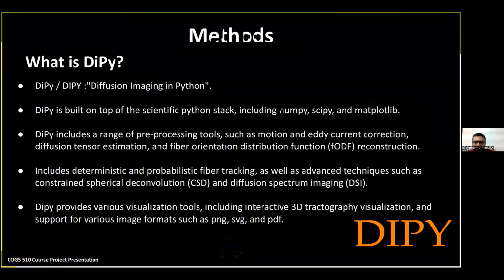So we got some introduction. Now we want to see what DiPy is. DiPy stands for Diffusion Imaging in Python, and it is built on top of the Python scientific stack, which includes NumPy, which is numerical Python, SciPy, the scientific Python, and the very common plotting library, Matplotlib.